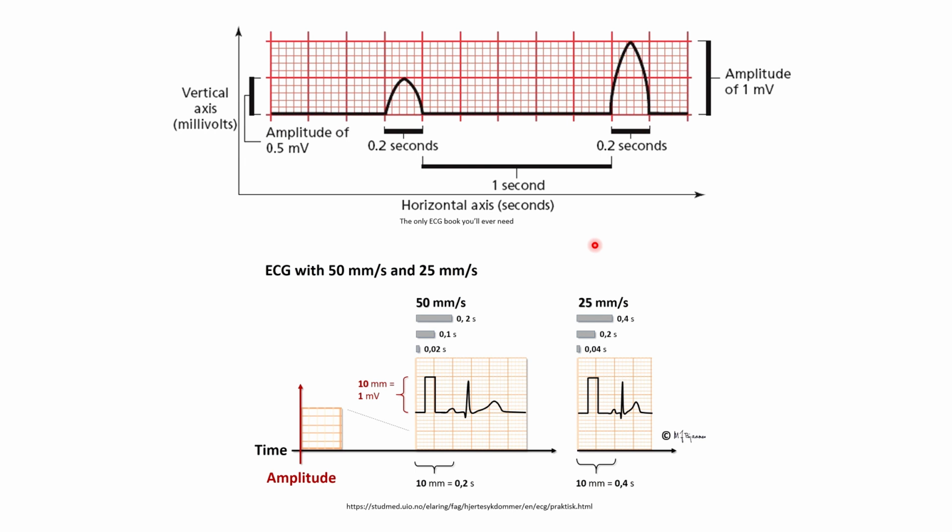First of all, we have to know something. The ECG has a vertical axis as well as a horizontal axis. The vertical axis we will count with millivolts and sometimes with millimeter as well. I will summarize it later. And in case of horizontal, we use seconds, and sometimes they use milliseconds. So it depends on your country and which one the doctors around you are using.